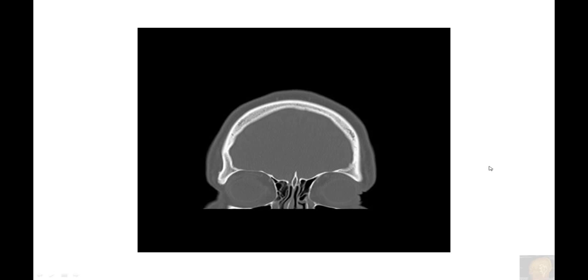And here is the crista galli, a more prominent bone in the middle that functions as attachment for the falx cerebri. And then here is the skull. The skull has two layers: the outer table and the inner table, and the medullary cavity. Basically, the stronger part is the solid part, outer and inner. In the middle part there are some holes and septations, so the marrow stays in there. And then the scalp, the skull, and then the brain.